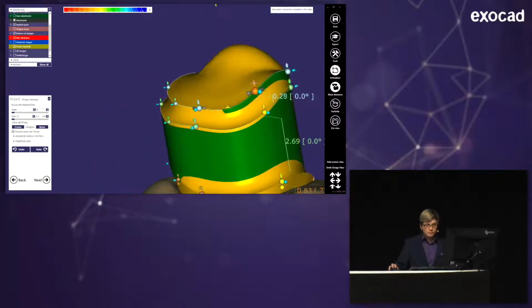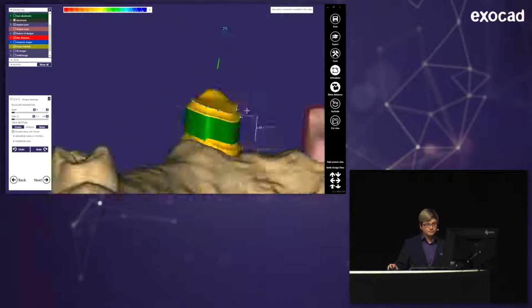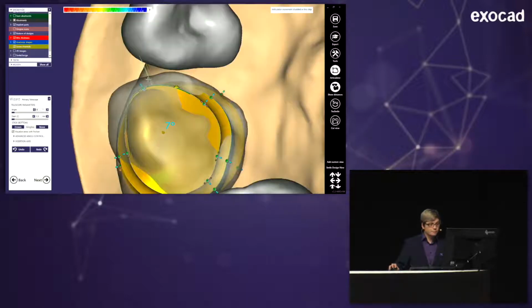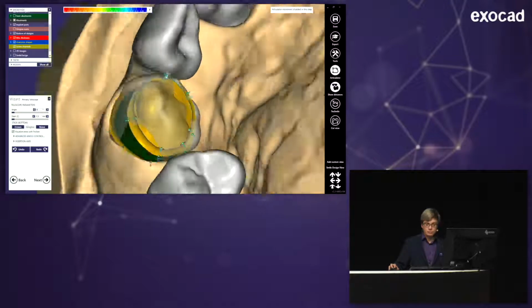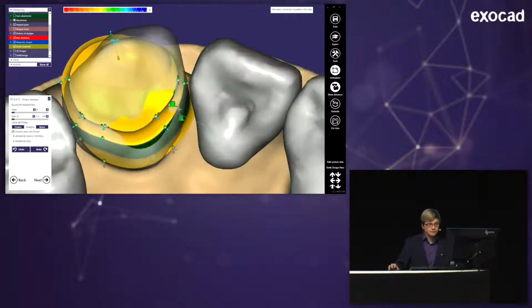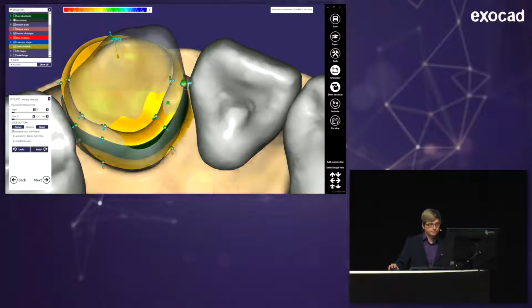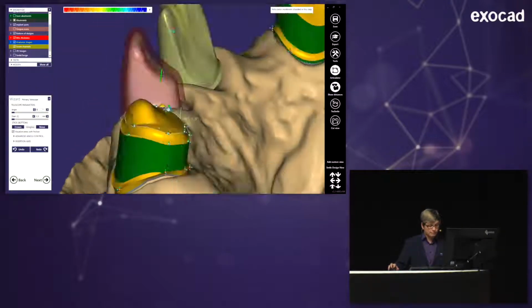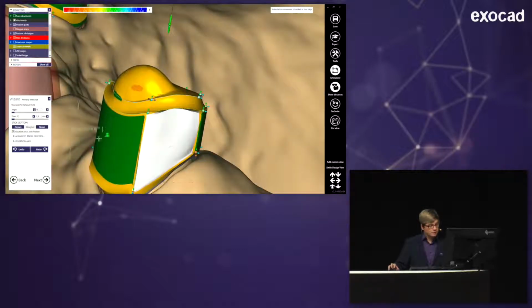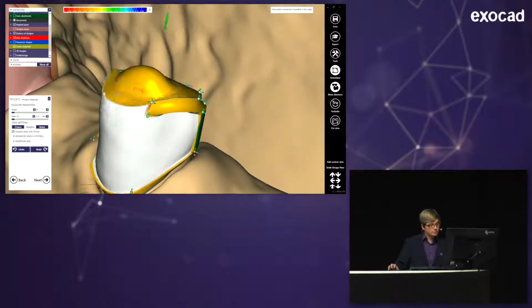And now I'm trying to get this really plain. Now, using my anatomy here, I can orientate where the points at the end have to be placed. You will see what I mean with that right away, because I'm pulling them out a bit. Because here, the rotation lock will be placed in the end. For that, I need a bit of space here. You can actually always activate more points if you need those for more control. And now that this is so far finished, I activate those points to switch them to anatomical shapes.